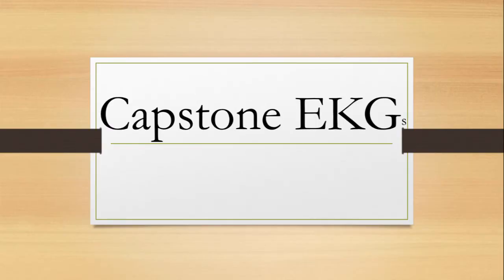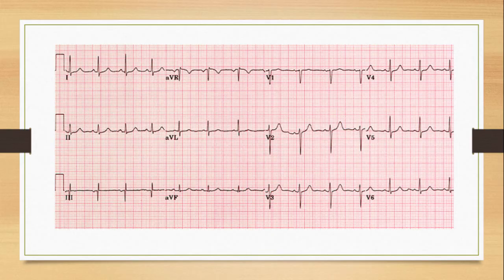So just a quick review of EKGs. This is just those EKGs that I think are pertinent to the Capstone course. I know you've covered them already. I'm not an expert on EKGs. I'm not an expert on anything, but this is just a quick review. So let's look at this.